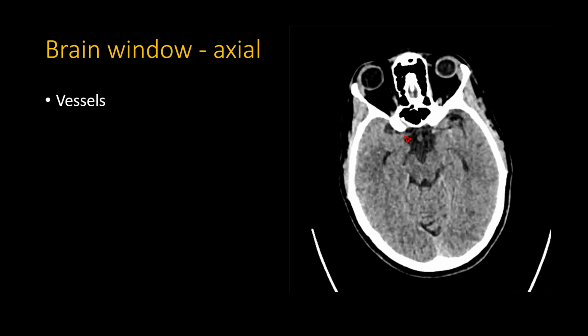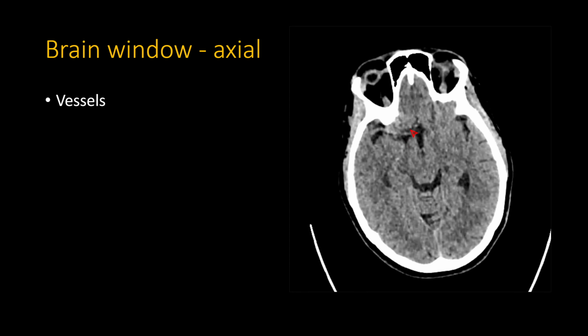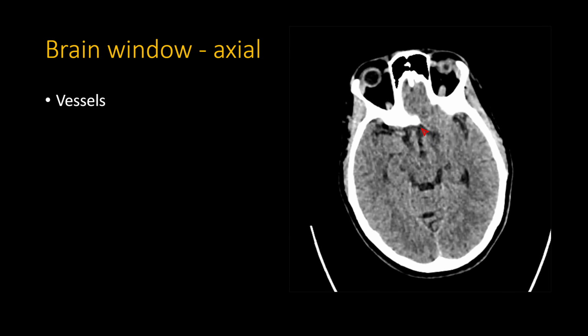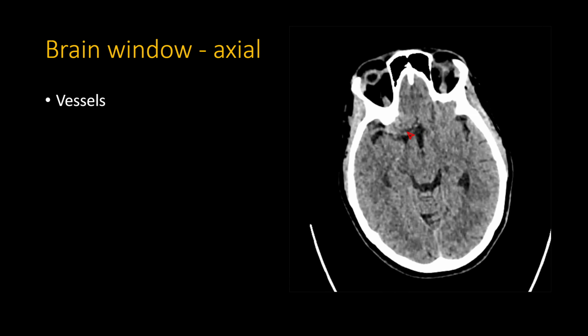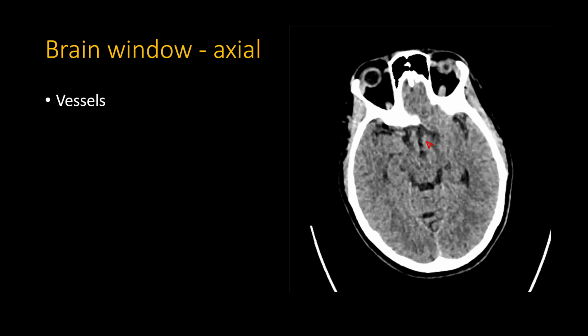As you saw, this is the carotid terminus splitting up into the MCA, and that's the M1 segment right here, and then the ACA right here, that's the A1 segment. Obviously, you're looking for aneurysms here, and also in the setting of your strokes, you're looking for any hyperdensity of the vessel. If you have thick section, do make the exercise of trying to look for these vessels. It'll be very difficult, but at the very least, look for hyperdense vessel signs in your MCAs, because that would be important to clue in about an infarct.